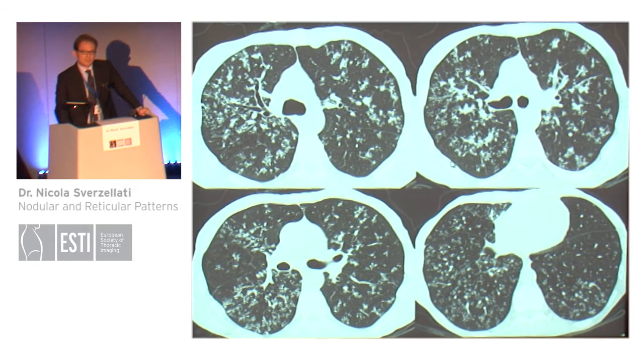This is an example of a patient with primary TB, and you can see diffuse tree-in-bud opacities, but you can also note that the tree-in-bud opacity may have different morphology, which may depend on several factors, such as the orientation of the bronchiole to the plane of the scan. So it is possible that at some levels, branching lines may represent the most striking findings, whereas at other anatomical levels, centrilobular cluster nodules may represent the dominant finding.